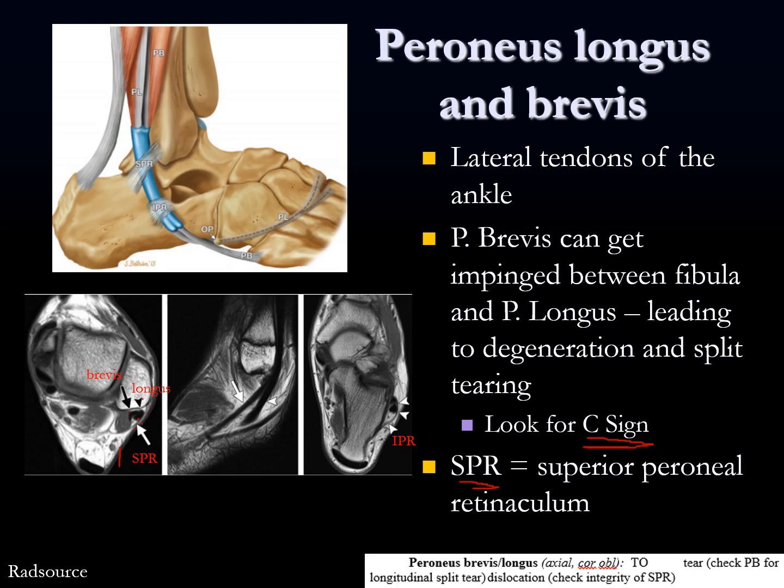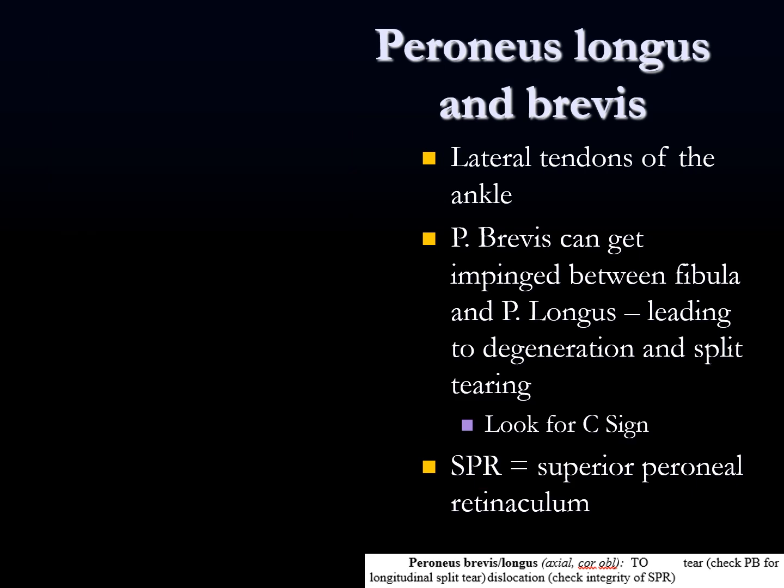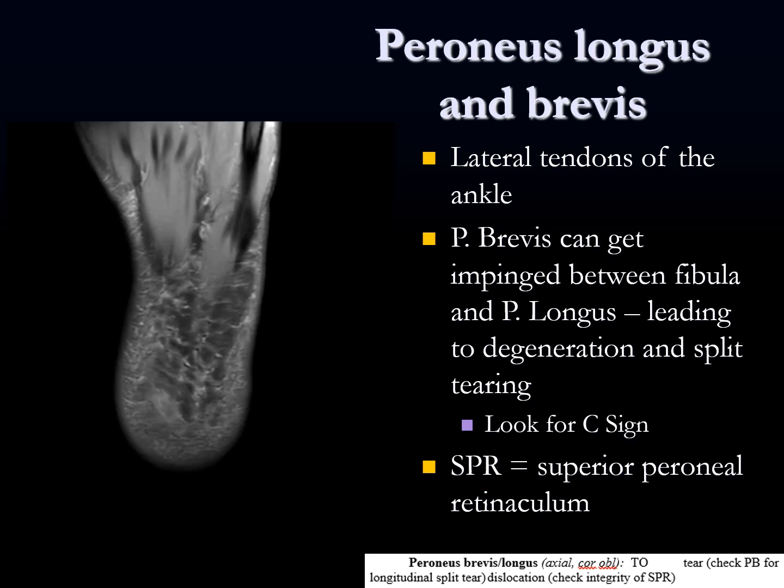Just adjacent to this, if you just keep going inferiorly, there's also an inferior peroneal retinaculum. I don't know if that's consistently seen because I can't think that I've noticed it very often or consistently, at least on ankle MRI. And here it is on a schematic picture of those peroneal tendons coming through. So we can look at some images of that.